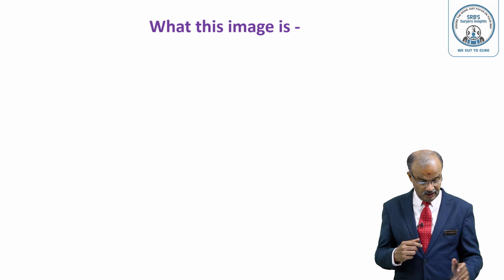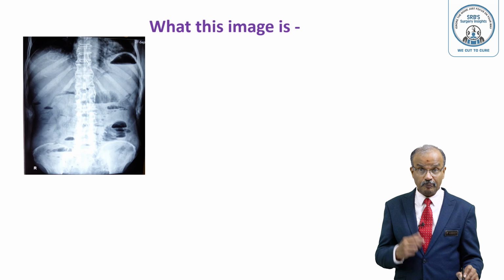Dear students, we'll discuss an image today, which is very commonly kept in the exam, in OSCE, in viva. So let's see what this image is. See, it is the plain X-ray abdomen.